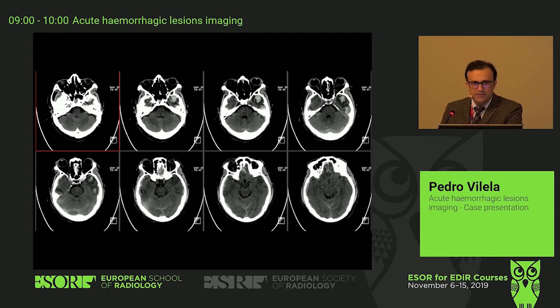Is there also a slight subarachnoid hemorrhage at the left occipital lobe? On the last image, left side area. Probably. We have also superficial subarachnoid hemorrhage and also a tiny component of blood in the interpeduncular cistern. Very good. So we have seen the different locations of hemorrhage.